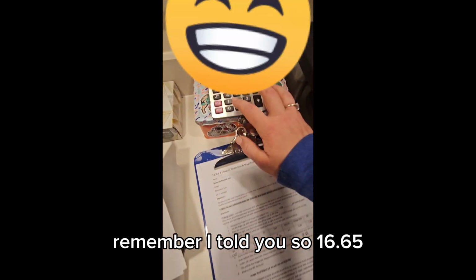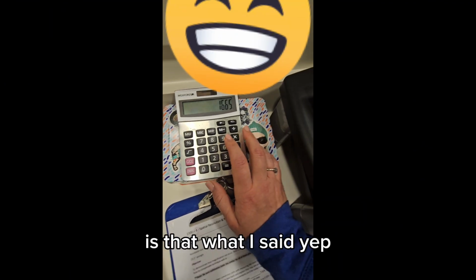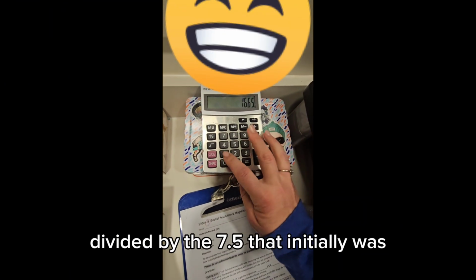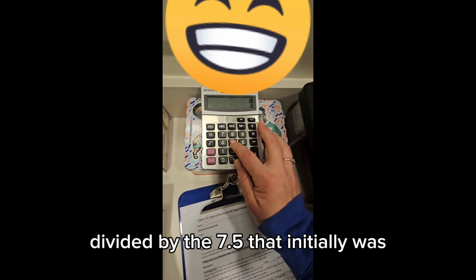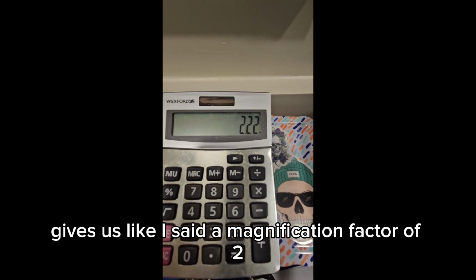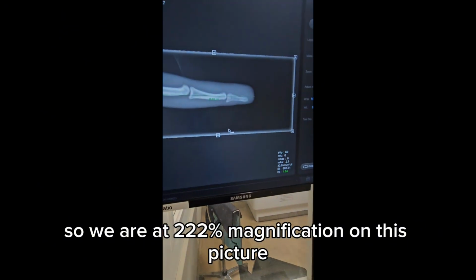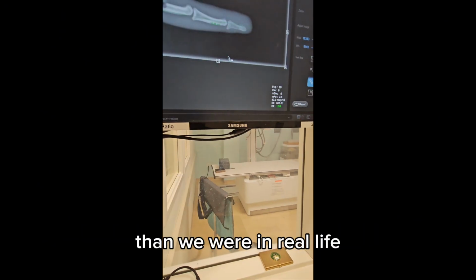Remember I told you? So 16.65, is that what I said? Yep. Divided by the 7.5 that initially was, gives us, like I said, a magnification factor of 2. So we are at 222% magnification on this picture than we were in real life, right?